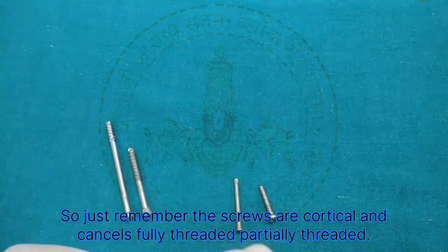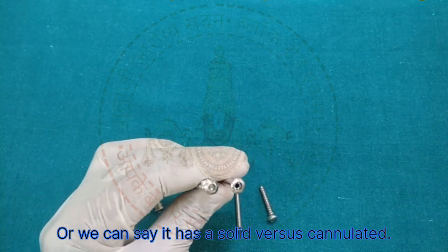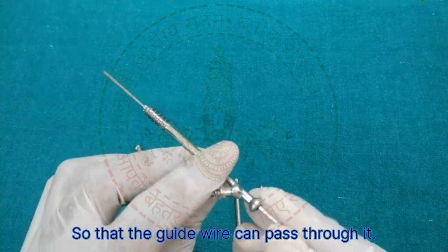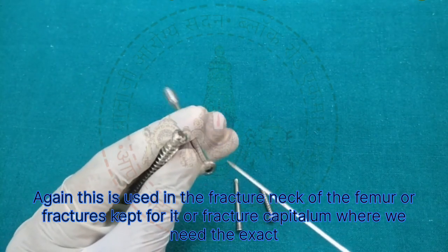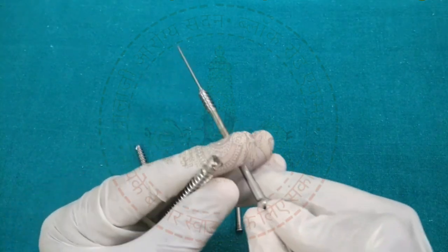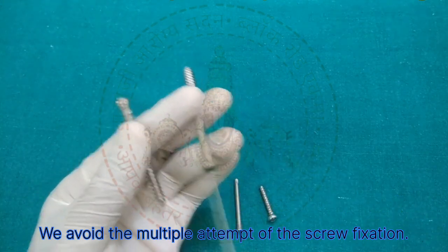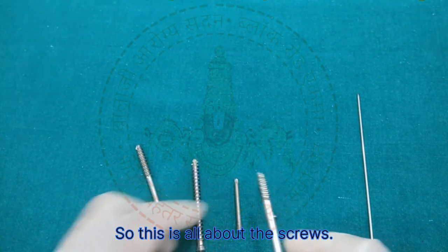Another classification is non-cannulated and cannulated, or we can say solid versus cannulated. You can see that this is the solid screw and this is a cannulated screw because this has a hole in it so that the guide wire can pass through it. Again, this is used in fracture neck of the femur, fracture scaphoid or fracture capitulum, where we need exactness. We insert the guide wire first, and over this guide wire we check the position and then insert the screw, to avoid multiple attempts at screw fixation. So this is all about the screws.